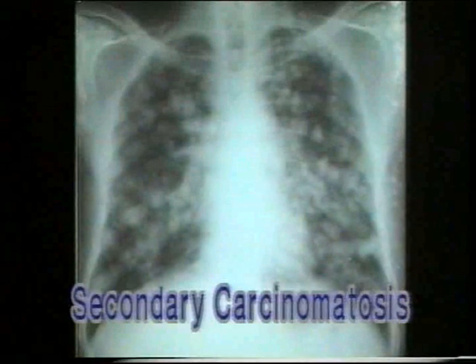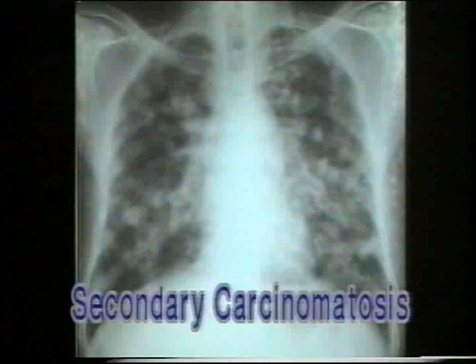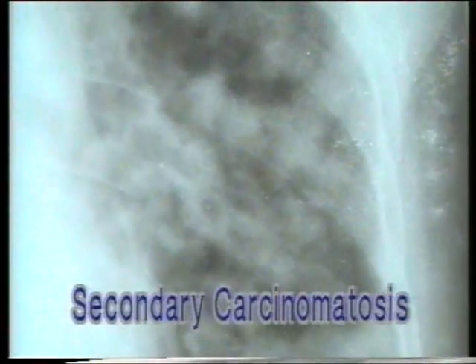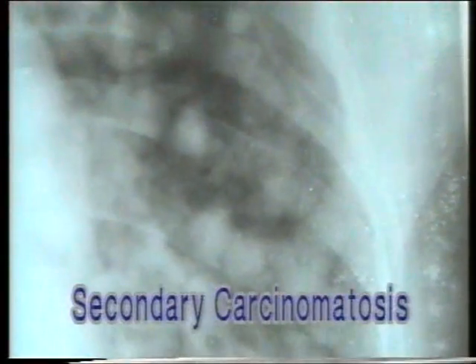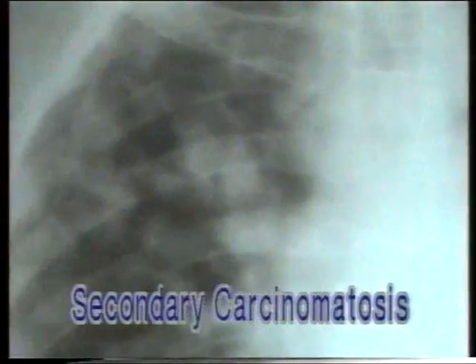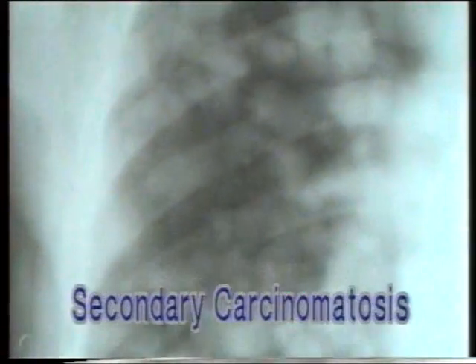Secondary carcinomatosis. This X-ray shows both lung fields riddled with small opacities of varying sizes. This is termed as miliary carcinomatosis or secondary carcinomatosis. In contrast to miliary tuberculosis, here the opacities are larger, less numerous, they are not uniform in size, and they may be confluent.